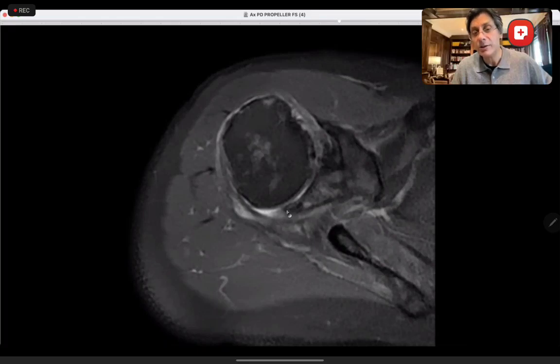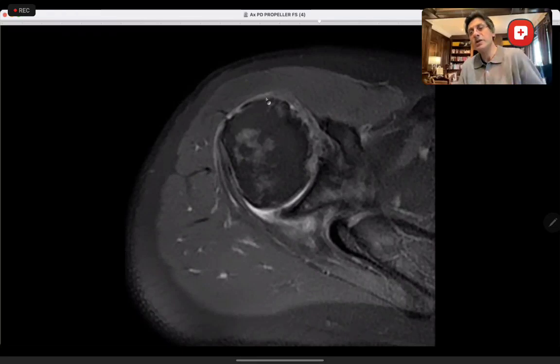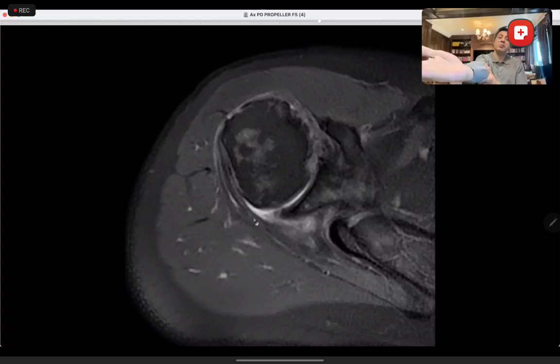The humeral head is slightly subluxed back. If you look at the posterior margin here and compare that to the humeral, if I was reporting it, I would probably say slightly subluxed back. But remember, this humeral head is internally rotated. Why I say that is this is the intertubercular groove. Normally the groove is here somewhere, but imagine if the patient rotates the humeral head internally, then this comes forward, so it starts looking this way. So this bit of subluxation is probably because the patient is holding the palm downwards. In other words, when we lie them in the scanner, we ask them to keep their palm upwards. But if you do this, then the humeral head comes like that.